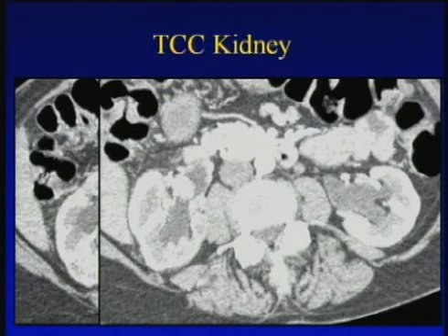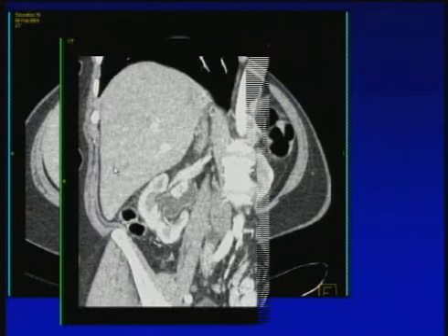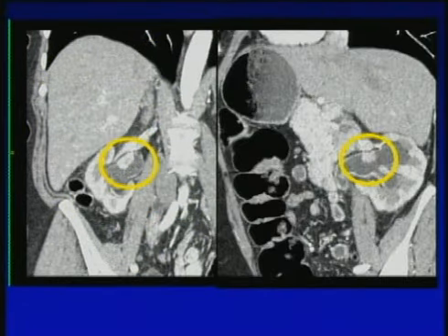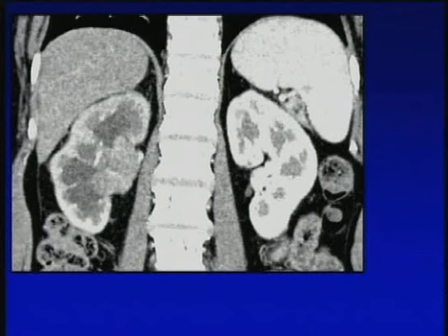Well, you look carefully at the renal pelvis on the right, and you look at a few more images, and you see evidence of patients having tumor masses in the renal pelvis and had other masses in the patient's ureter. This patient had multifocal transitional cell carcinoma. So one of the things you recognize is the cortical medullary phase, by showing you changes in perfusion, allows you to then look carefully as to the cause, whether it's arterial or venous or potentially obstructive.